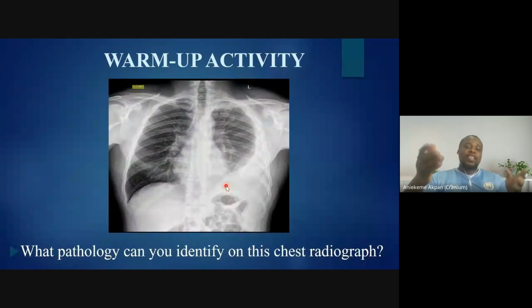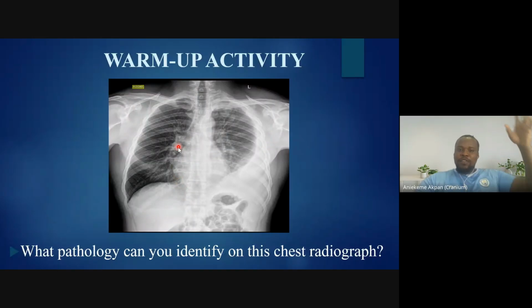Though there are some features on chest X-ray that can suggest pericardial effusion, when the heart looks like a bag. A bag, this bag that they normally put coins in, the money bag sign. But that's still not sufficient to say there is pericardial effusion. So the man was telling me that most of the time when they diagnose a patient with cardiomegaly, they come for echo, and the echo just shows normal findings. That he knows that is likely due to the inspiratory effort and all.